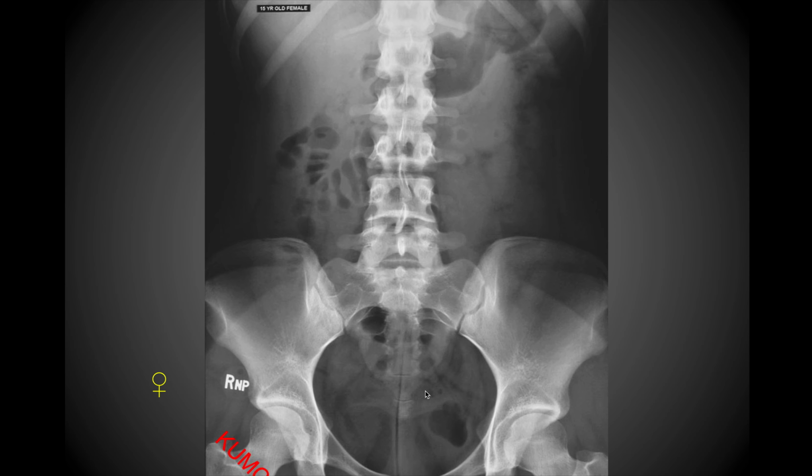Now we're looking at a female scan, and on this one you can again make out, hopefully, the difference in the circularity and the width of the bony pelvis. You can also note the more flared out, wide positioning, so to speak, of the iliac bones. So again, this is a female. The scan is cut off on the bottom so that you can't actually see the subpubic angle, but if you could, it would have a much wider angle than what you saw on the male as well.